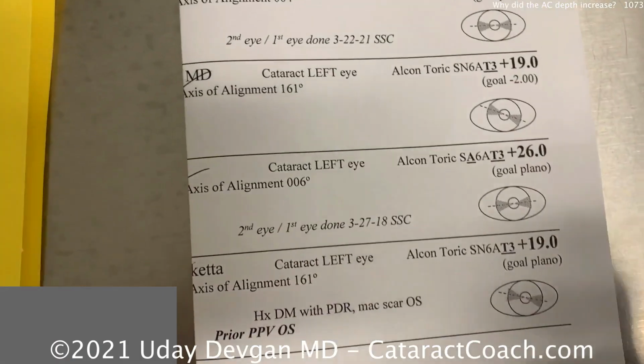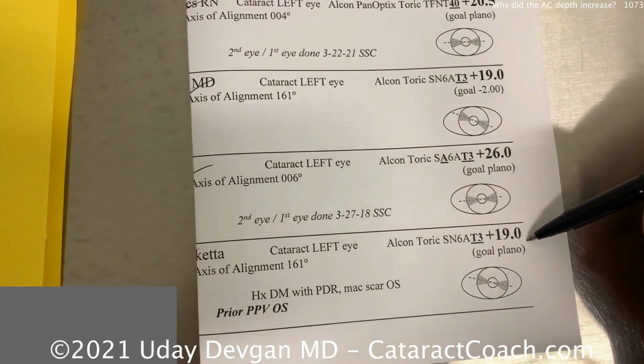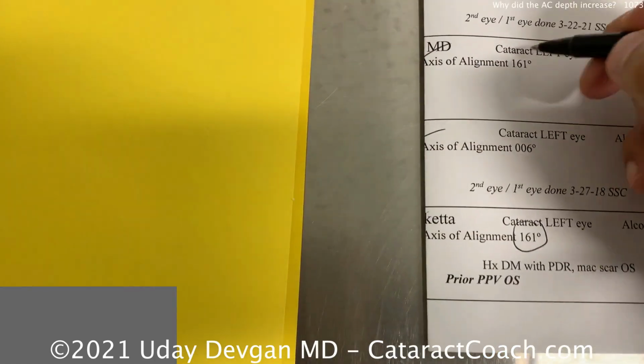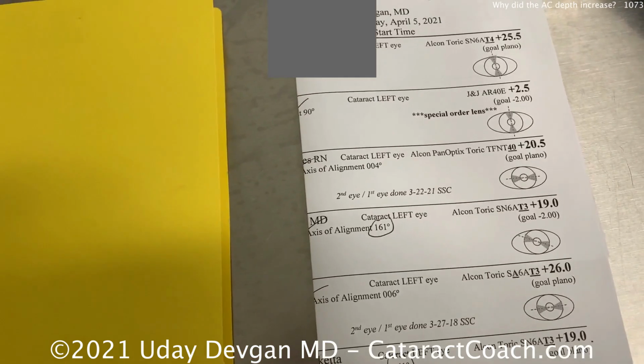What do we find out that's unusual? This patient and this patient have the exact same lens, but also even the same axis of alignment. Is that true? So we've checked all the data, checked the charts, looked at the topographies again, and everything checks out okay. So you have to make your own OR sheets like this so you know. Ultimately, the responsibility is that of the surgeons. If there's an error or transcription problem or a duplication error, it's always your fault.